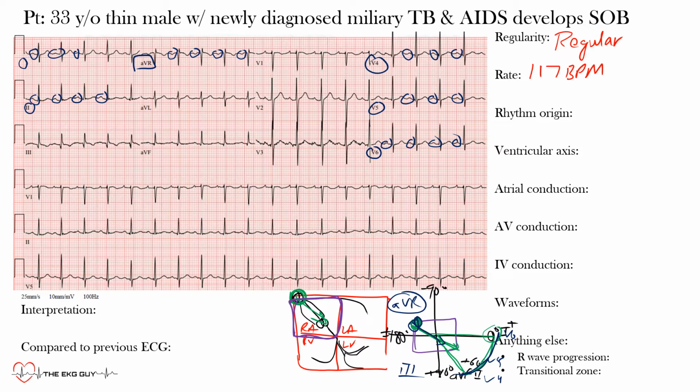Now, a few other features of sinus rhythm. Remember, we want the P waves to have the same morphology. So if you look at lead 2 here, just look at all the P waves throughout, they would have similar morphology, okay. And notice that there's that 1-to-1 ratio, 1 P wave for every QRS complex, and the P wave is always preceding that QRS complex, okay? So those are all components of sinus rhythm. Because we meet all that criteria, we are in fact having a rhythm that's originating from the sinus node. So we have sinus rhythm, or SA, sinoatrial, okay?